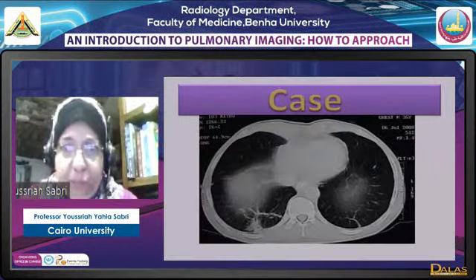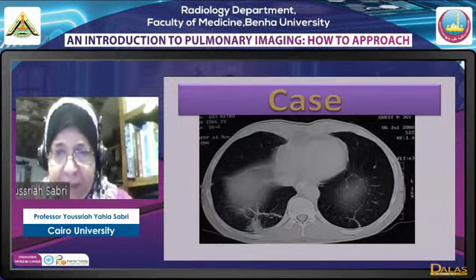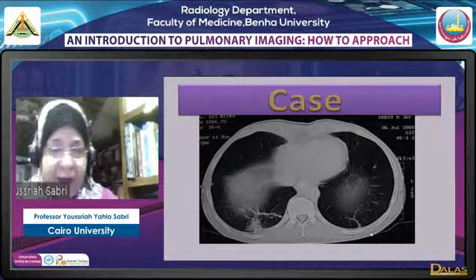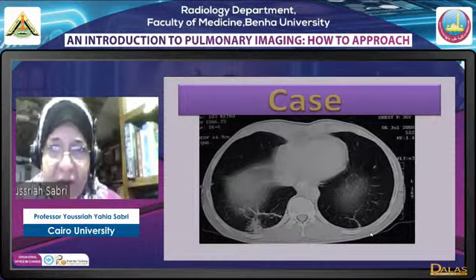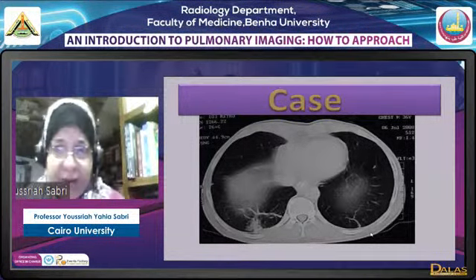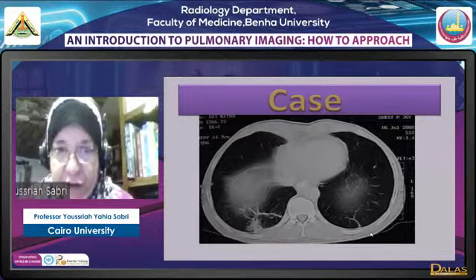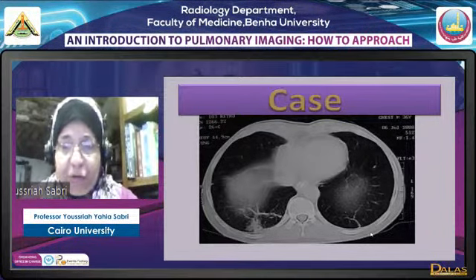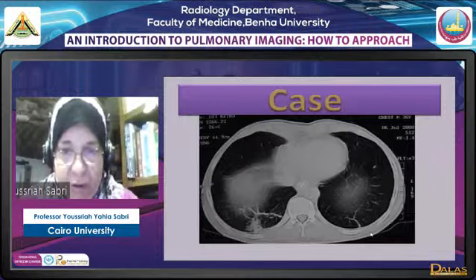Okay. Now here we have another pattern of fibrosis, which we call parenchymal bands, where we have a linear opacity reaching to the pleura, having an angle with the pleura. Bilaterality of the lesion, parenchymal bands in this 36-year-old male patient, may suggest an etiology of vascular insults, previous infarction due to DVT or whatever, because of the appearance here.